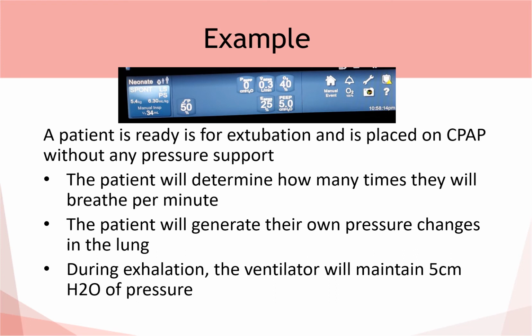When we look at this example, and I pulled the image that we had from the very beginning, this patient is on a spontaneous mode of ventilation, picked up right here. The patient is just on CPAP without any pressure support. If you look at this P-sup reading, it's listed as 0. What that basically means is every time a ventilator breath is triggered, when 0.3 liters per minute are moved through the circuitry, there's actually no support on inhalation. The patient isn't getting any additional ventilator support.